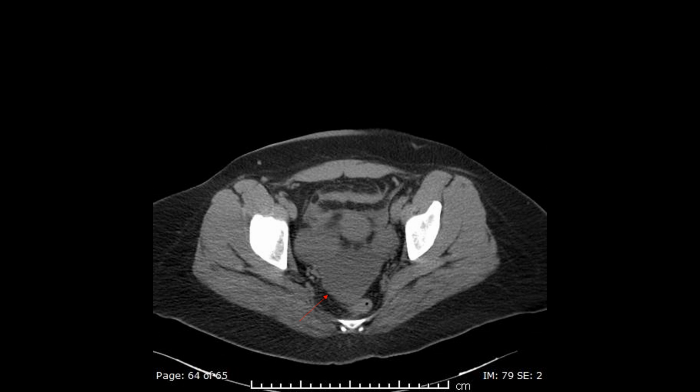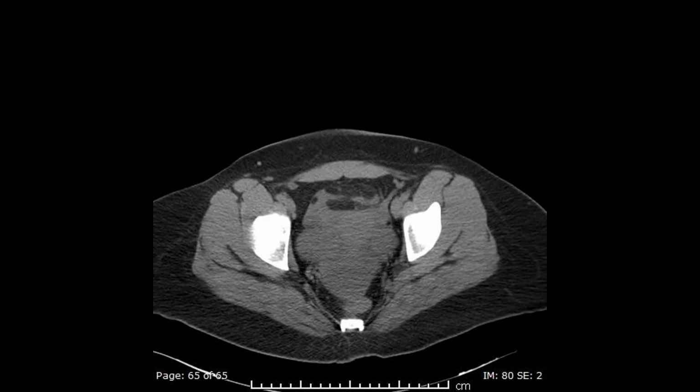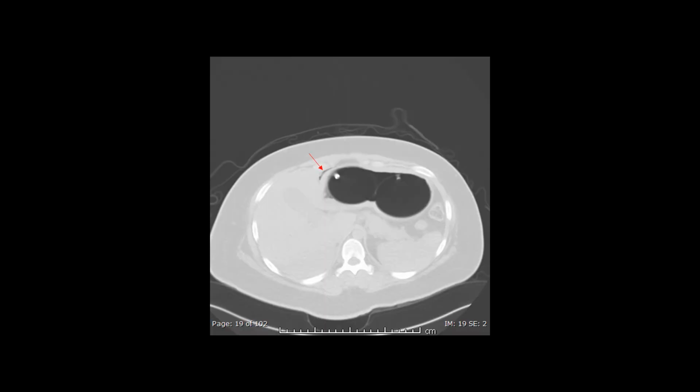This is free fluid in the pelvic peritoneal recesses. It may denote perforation, but the presence of extraluminal gas gives more confidence to the diagnosis of perforation. See how the amount of extraluminal gas is very small and how it may be useful to change the window level and the window width to be sure that this is gas.